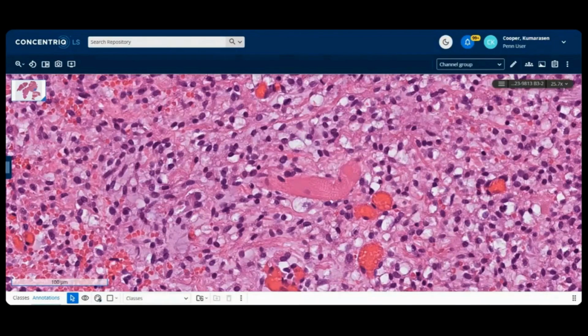And this guy, for some reason, just recurred many times, even though the morphology, you can see, I've shown you many fields. Have you ever seen the mitosis? No. Any pleomorphism? No. No necrosis. But this thing just kept coming back and back.